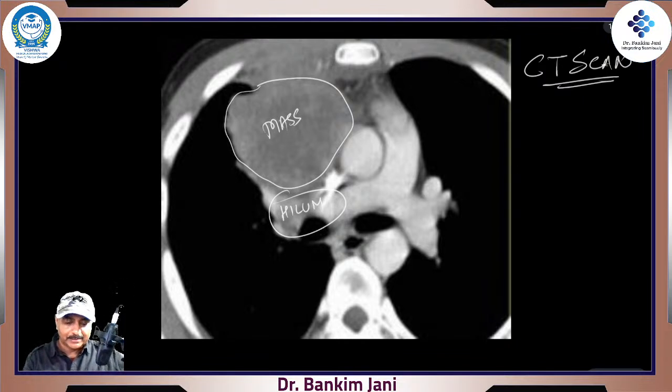So that's why when the X-rays were passing through it, we were watching this mass superimposed on the hilum, and that's why it is pushing the trachea on the opposite side. All settled. Same patient, right? Same patient.